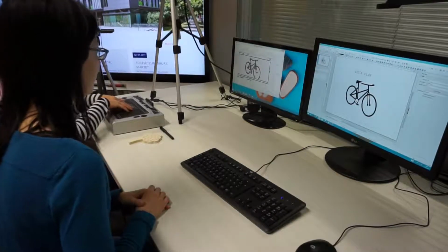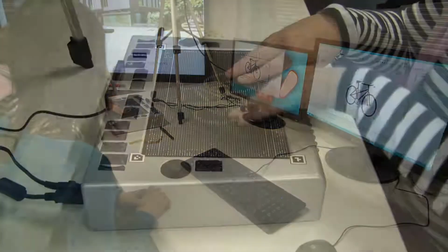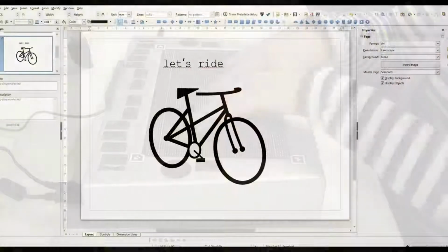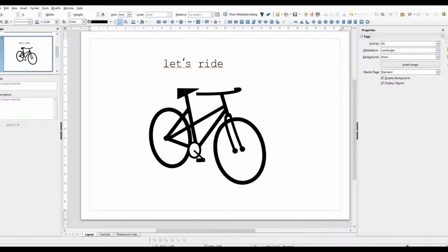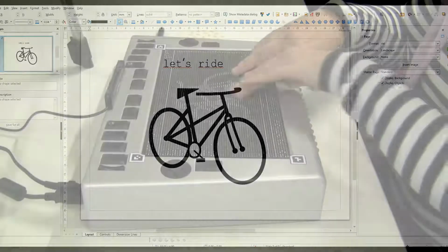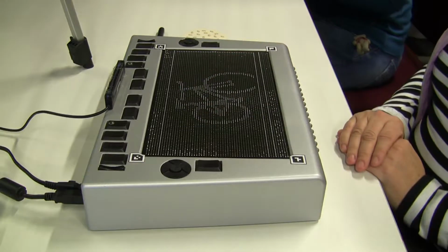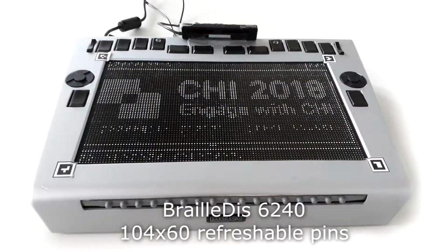The Tangram workstation enables a blind or visually impaired user to access a currently evolving graphic and act as a lector. For drawing the graphics, we use the open-source application Draw from the Office suite LibreOffice. The Tangram extension takes a screenshot of the current visible drawing area and turns it into a black and white tactile image. For displaying the tactile image, we use a two-dimensional dynamic pin matrix display.